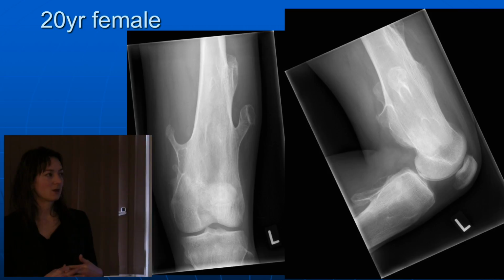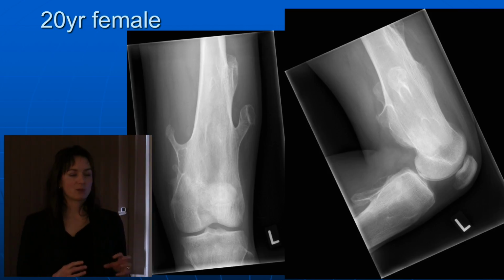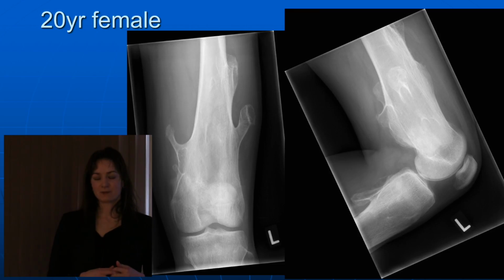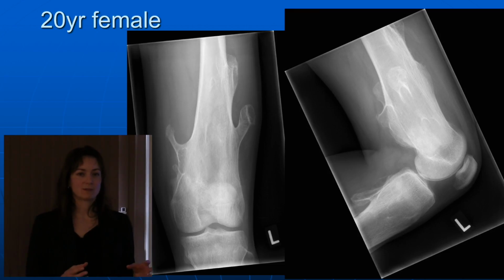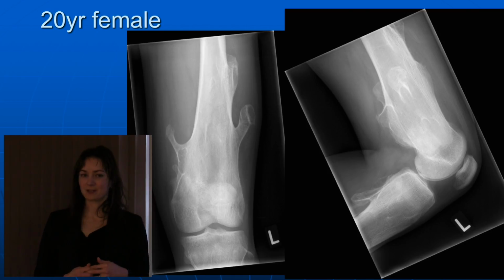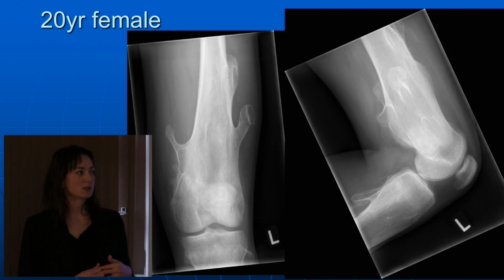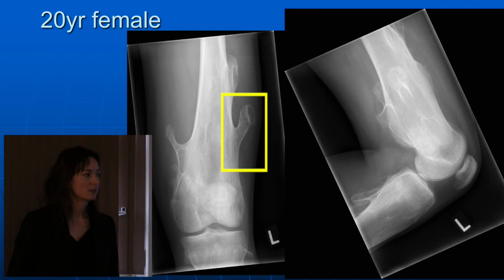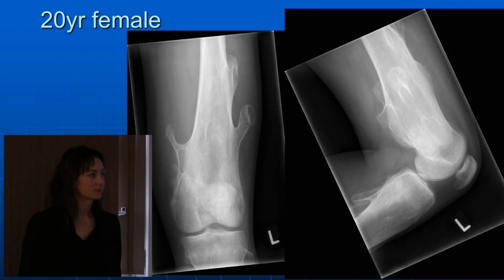The hallmark of an osteochondroma is, people call them exostoses. That's just a generic term that doesn't really mean anything, to mean something protruding from the bone. You can always classify an exostosis and say what it actually is. So the hallmark feature of an osteochondroma is that the medullary bone continues into it. Can you see here it's lined by cortex and the medullary bone goes into it. So these are multiple osteochondromata. And these have cartilage sat on top of them.